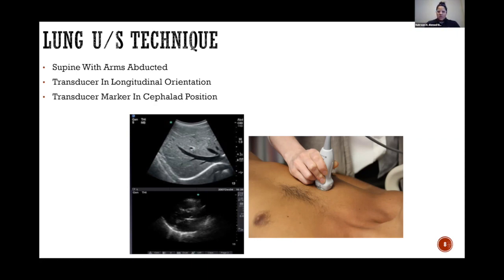Can you guys actually see me as well? Yes. Okay, great. So here I'm holding a Butterfly ultrasound probe. This is in the shape of a cardiac ultrasound probe. What you're seeing here is that there are many lines and dots. The dot that is important is this dot here on the side, which is the orientation marker. And this is what you're seeing on the screen as well.